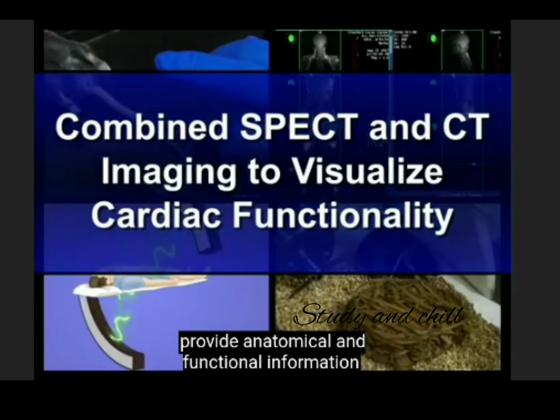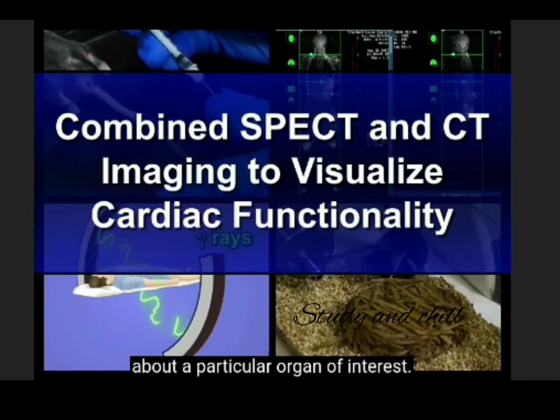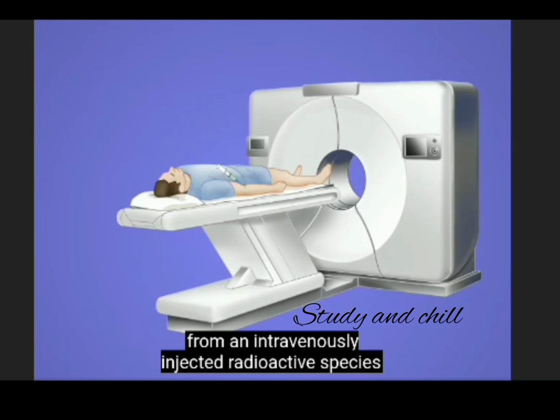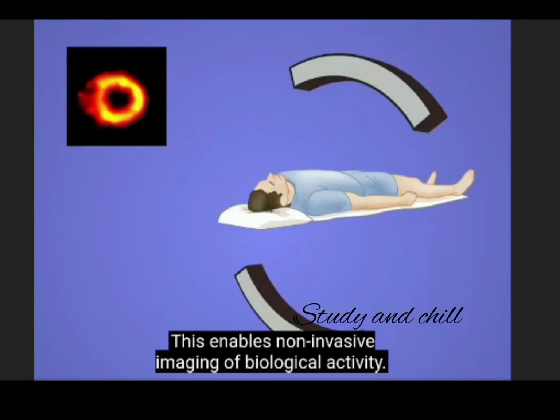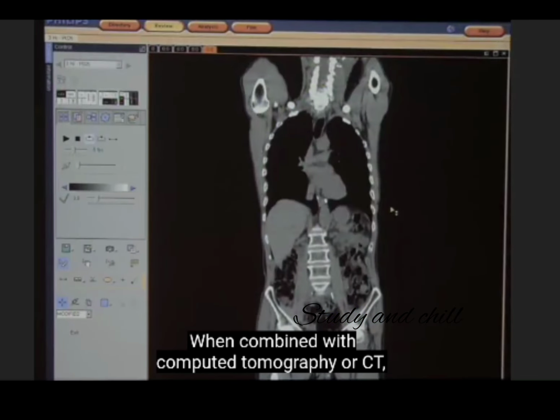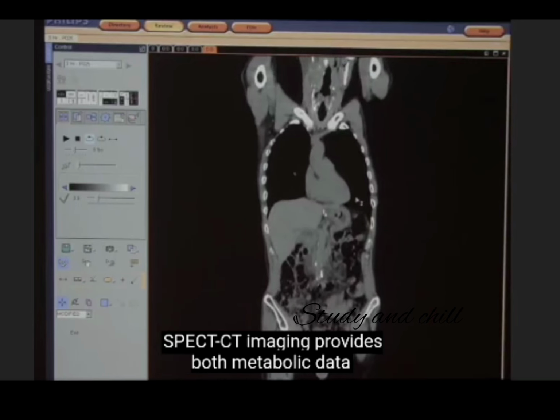Single photon emission computed tomography, or SPECT imaging, directly measures the radiation from an intravenously injected radioactive species via a gamma camera. This enables non-invasive imaging of biological activity, rather than just a snapshot of the organ. When combined with computed tomography, or CT, SPECT CT imaging provides both metabolic data and anatomical information that can be useful for a wide variety of applications.